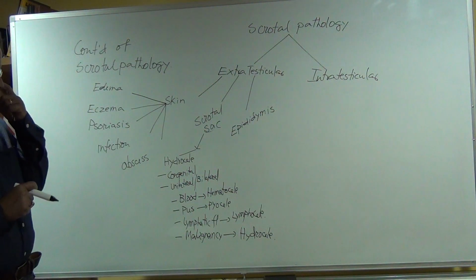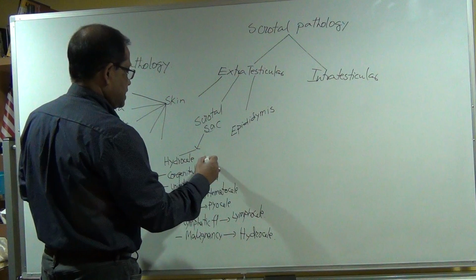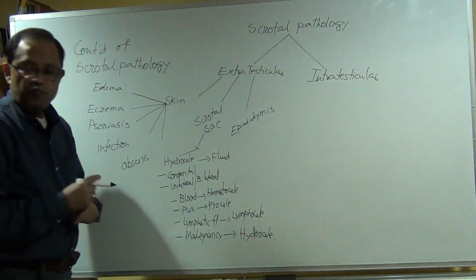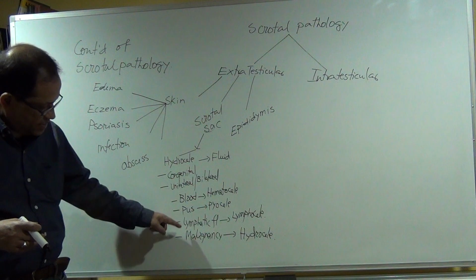Keep that in mind. This hydrocele is a fluid collection. But what type of fluid? It could be this.